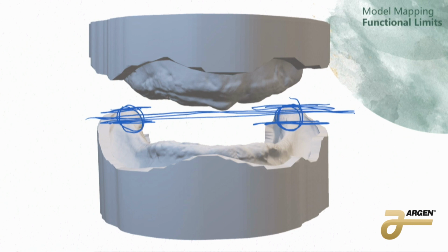But now if we're looking from the side, how high are the anteriors in relation? If we have nothing to go off of, we don't have accurate records, we haven't seen the patient's mouth, typically what you want is to not have a reverse smile. So if this is your anterior and this is your posterior, you don't want it to be going back like this, because as they're talking, you'll just see their posteriors in the back. So find your posterior and then typically set your anteriors relatively flat to that, or the opposite, like downwards, right? We have no other information. We don't know where their lips are, so we want to use the best that we can.